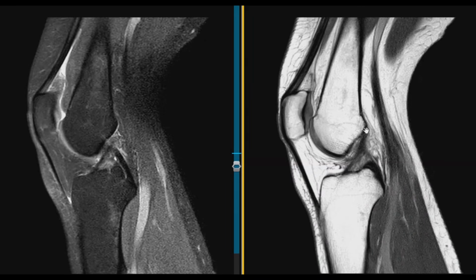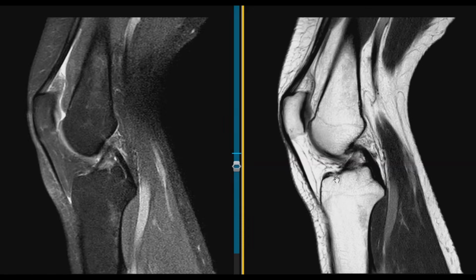And here it is. We see the ACL coming off the back of the femur, coming down obliquely. This dark band is the anterior cruciate ligament, or ACL, and it attaches to the front of the tibia. And the ACL keeps the tibia from shifting forward. So if the tibia tries to go forward, this is almost already taut right now. If it goes any further forward, this will become completely taut and stop the anterior motion of the tibia. When this tears or ruptures, the tibia can drift forward, which we call anterior tibial translation.